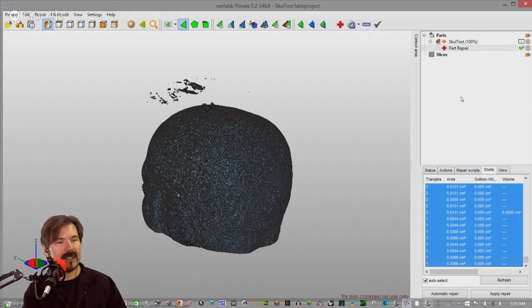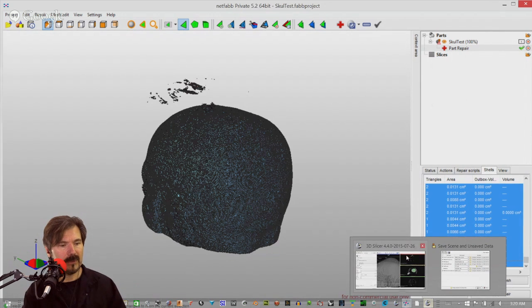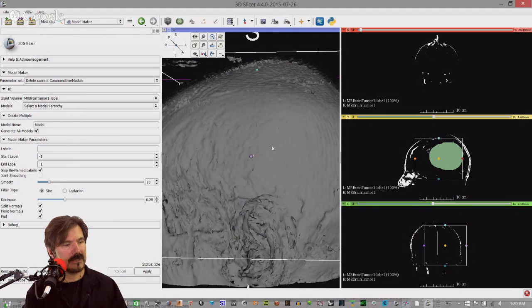So I'll tell you what, I'll let this work in the background, and I'll jump back to this. Hopefully it won't eat up too much processing time, and I can still.